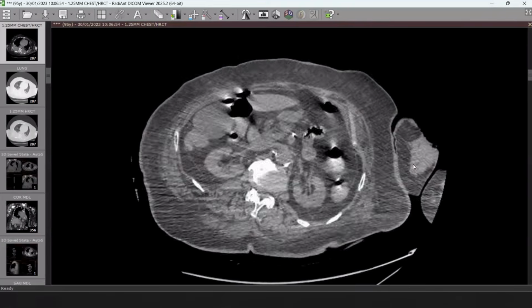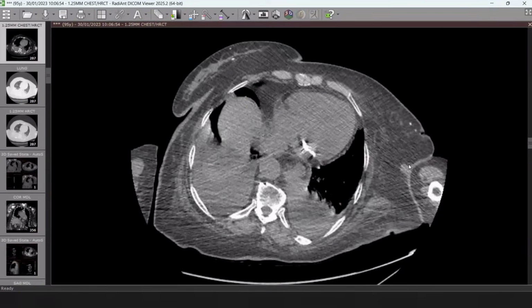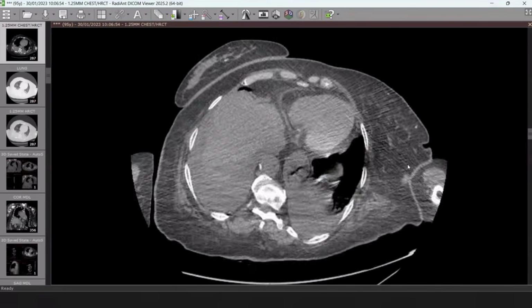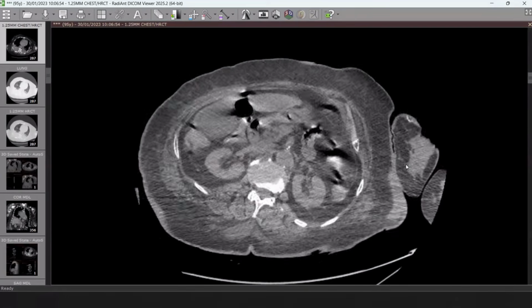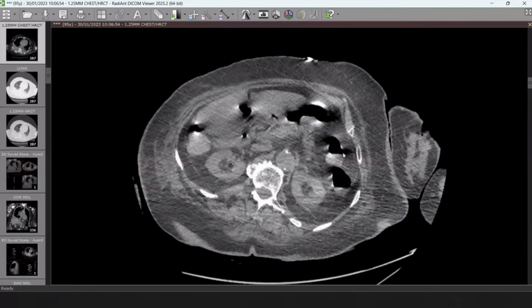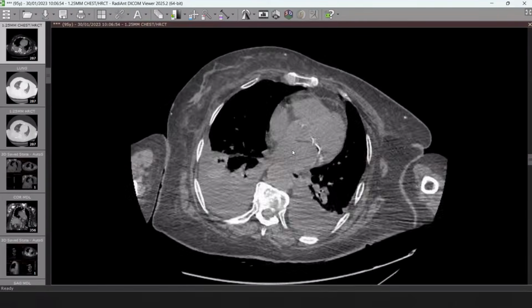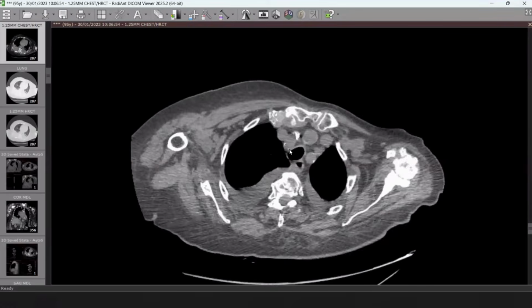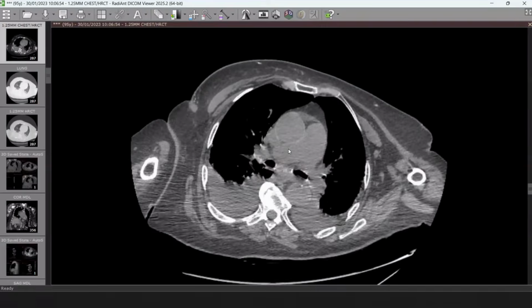So it was a finding without any symptoms, or the patient didn't inform us of any of these symptoms. But my message here is to check the chest wall and the breast in every case. This mass is an ulcerating mass. Sometimes this abnormality can solve many issues in the scan. So please take care of the breast. We diagnosed many cases of breast cancer in CT scan of the chest. So the message here is to check the breast shadow within your checklist.